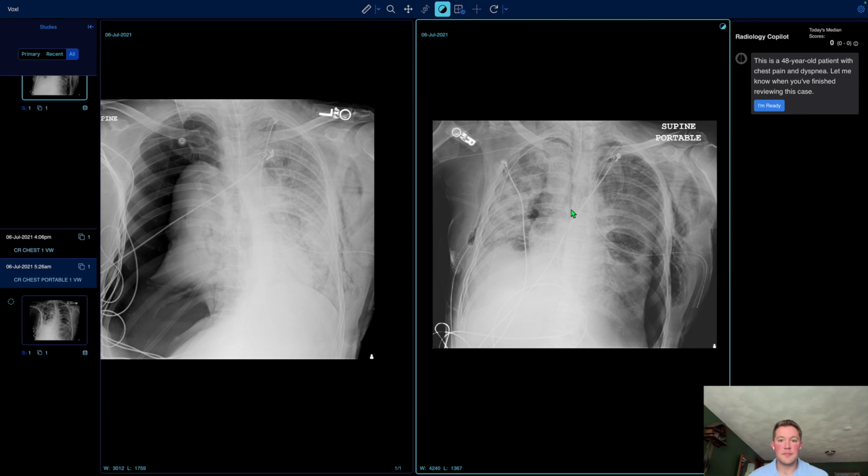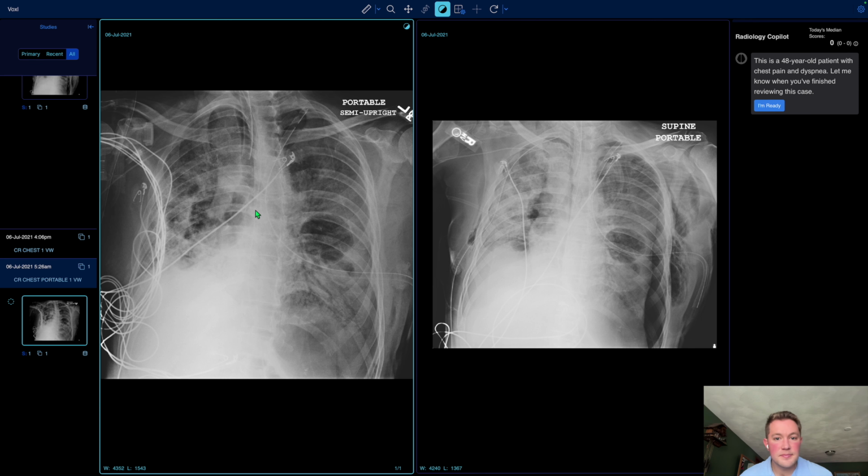Great. So we saw, and then you mentioned re-expansion pulmonary edema. Let's look at before the pneumothorax happened on the right side. And you can see there was already a diffuse alveolar airspace opacity, and maybe this was diffuse viral pneumonia. Maybe it was already an element of pulmonary edema or a combination of the two. But it's definitely gotten worse.